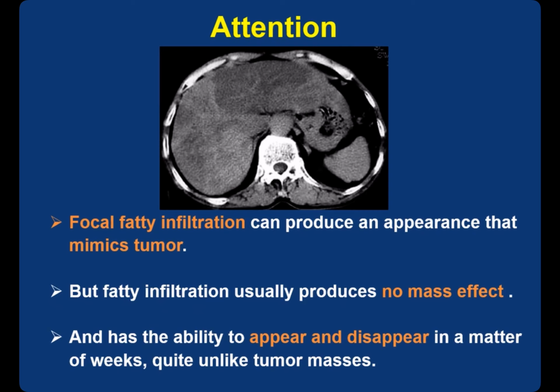What we should pay attention to is that focal fatty infiltration can produce an appearance that mimics tumor, but fatty infiltration usually produces no mass effect, and it has the ability to appear and disappear in a matter of weeks, quite unlike tumor masses.